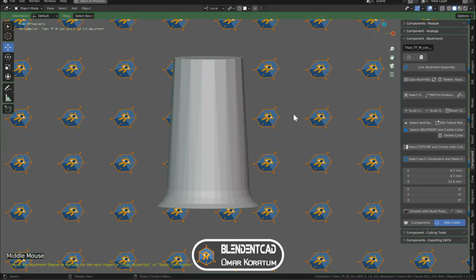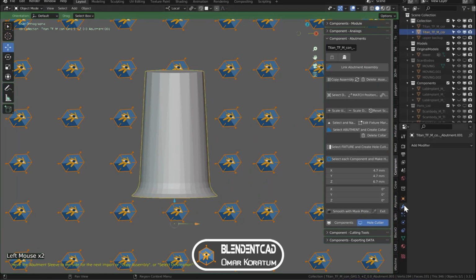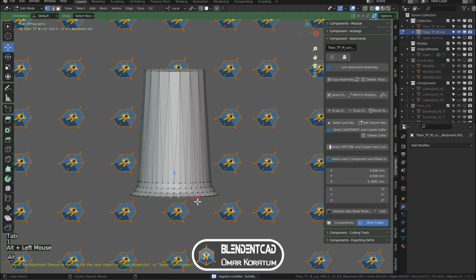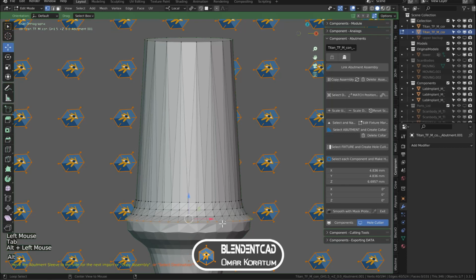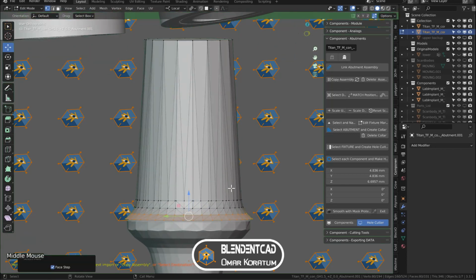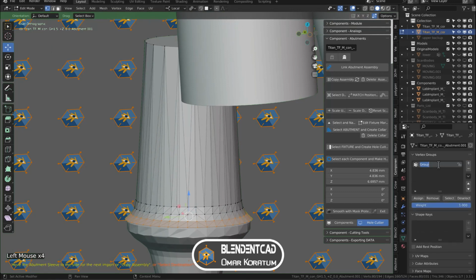After creating our custom sleeve, we have to do some adjustments. We have to select the sleeve, go to modifiers, Solidify, and then add the 100 micron of offset, and then only rim. We apply it, then remove bottom vertices, and to make a better fit, we can select the bottom vertices and then Control plus in the numpad to select margin. We can name this as margin.